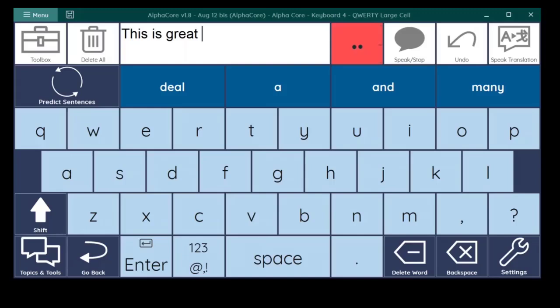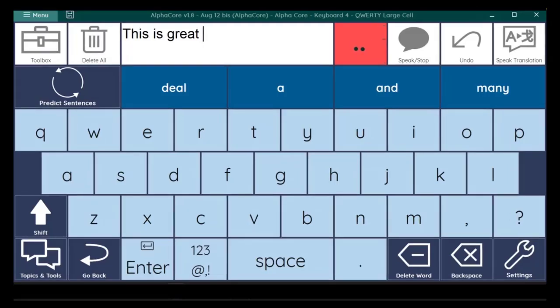Once paused, you can look anywhere without selecting an item. Mastering the use of the pause button, found adjacent to your message window on each page, is crucial for relaxed and confident use of dwell selection. You can decide how quickly or slowly selections are made by adjusting dwell times.